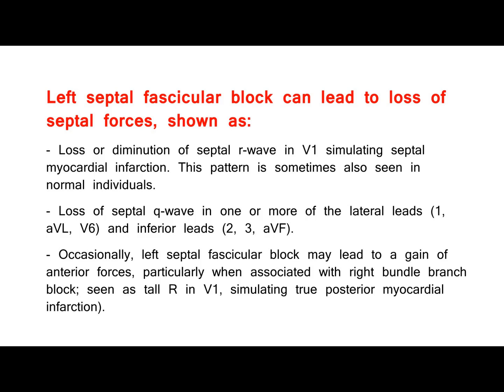Left septal fascicular block can lead to loss of septal forces, shown as loss or diminution of septal R wave in V1 simulating septal myocardial infarction. This pattern is sometimes also seen in normal individuals. Loss of septal Q wave in one or more of the lateral leads, 1, aVL, V6, and inferior leads, 2, 3, aVF. Occasionally, left septal fascicular block may lead to a gain of anterior forces, particularly when associated with right bundle branch block, seen as tall R in V1, simulating true posterior myocardial infarction.